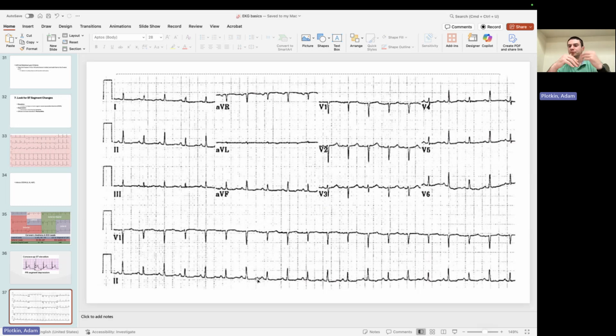So that tells me that there might be an effusion around the heart, and the heart is swinging through that effusion. So when you have a nice effusion that surrounds the heart, such as in cardiac tamponade, okay, what happens is the heart beats and swings in the effusion one way, and then when it gets really close to the effusion, it leads to a low voltage QRS, right?